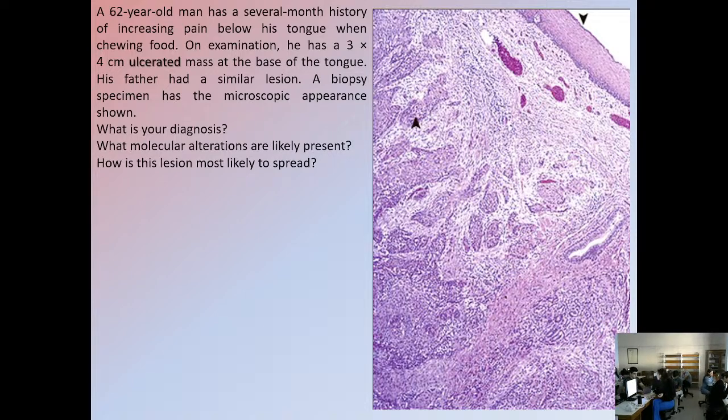Yes? But how would we know that the margins are true since we have normal appearing epithelium? Yes, that's why he checks it with a biopsy, because he cannot know. In this area, you see normal appearing mucosa macroscopically. However, there is cancer underneath. True invasive cancer. You see all these islands of squamous cells are frankly invasive cells. So that's the way to check it. You'll take a frozen section biopsy, and we have to answer within 10 minutes because the operation has not finished, okay? So that's how we'll check this.